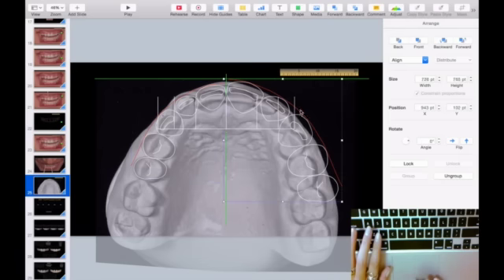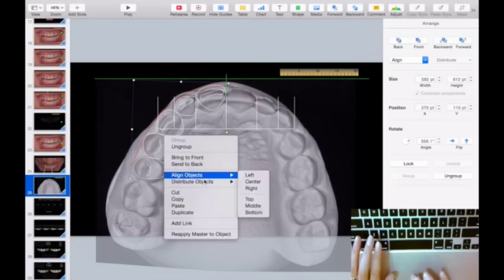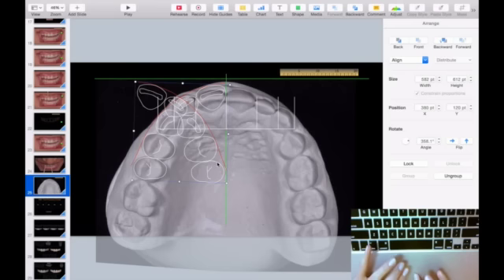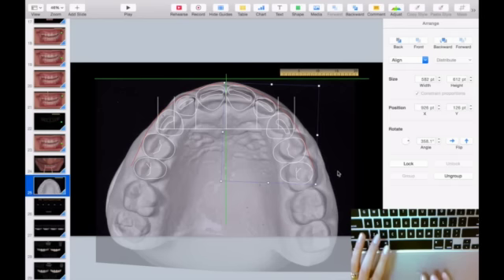We'll do the same thing on the other side. What you can do is you get here, duplicate, flip horizontal, and you bring it to this side. It's never gonna be perfect. You're always gonna have to adjust it because no side is like the other.